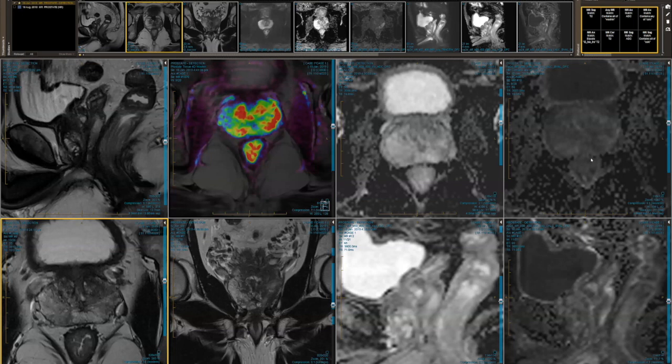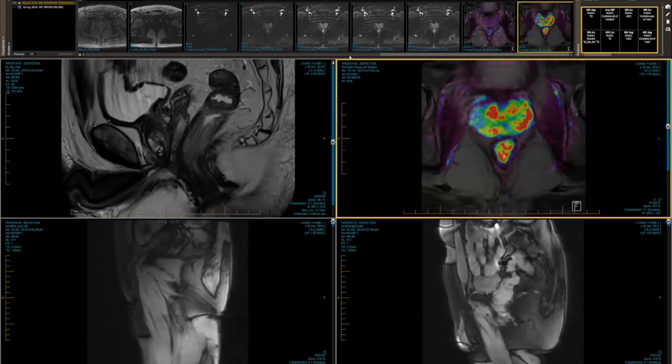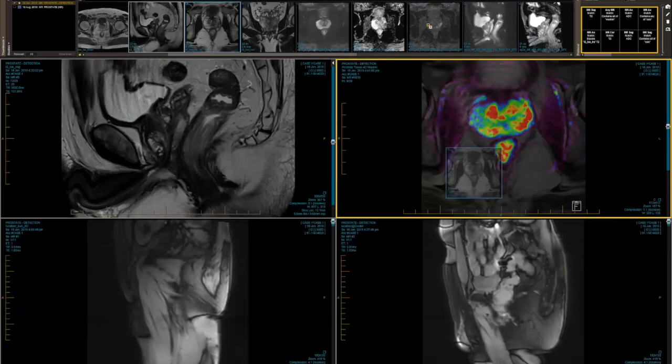They're the pictures on the right-hand side of the screen. This is the post-contrast images, which we use the wash-in phase. So it's the early parts of the contrast amalgamated together and put on a background of a T2 image. So what we might do is we might make life a little bit easier. I'll just link the ones that we use the most of.